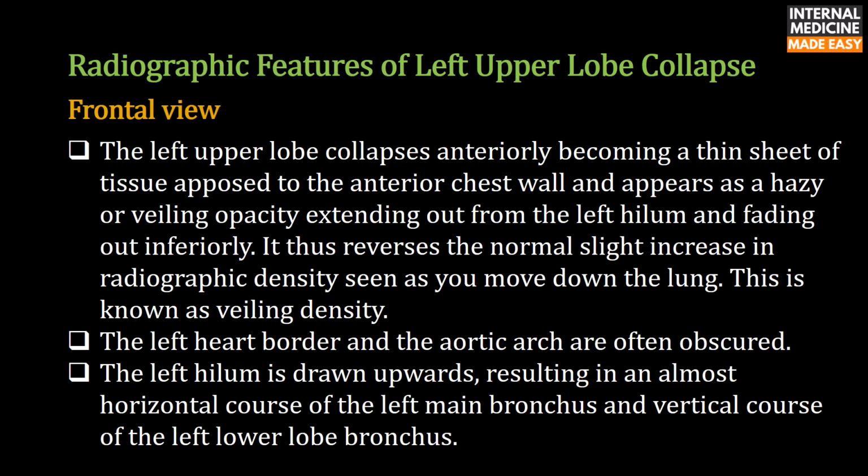The left heart border and the aortic arch are often obscured. The left hilum is drawn upwards, resulting in an almost horizontal course of the left main bronchus and vertical course of the left lower lobe bronchus.